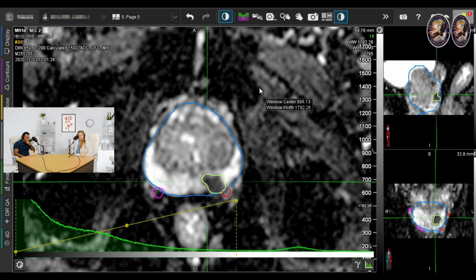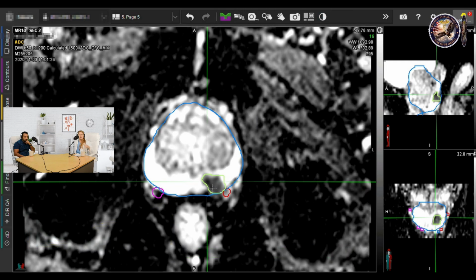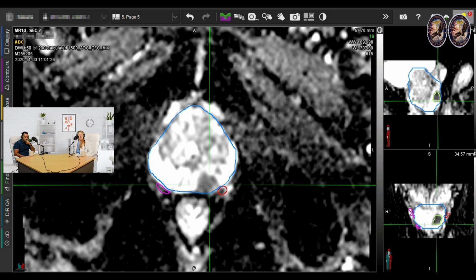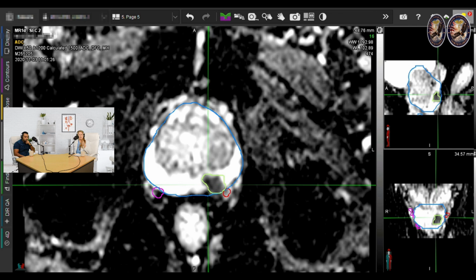The pathology also demonstrated, actually I want to, so when I do this, you see that I'm brightening up the resolution of the image. And when you do that, if you're in a hurry and you want to really make sure that you're seeing tumor, it will never lighten up.